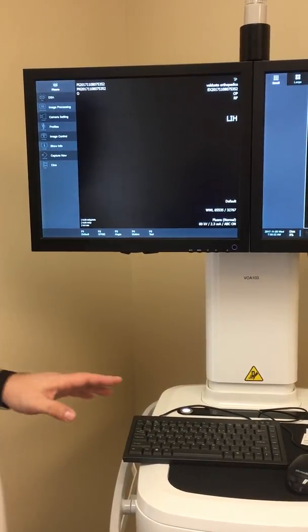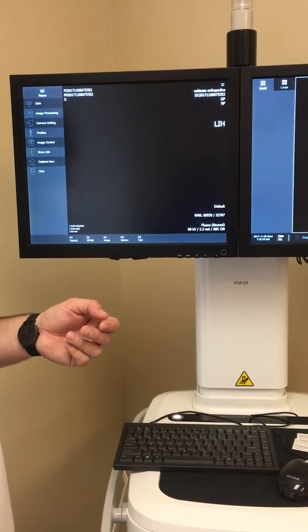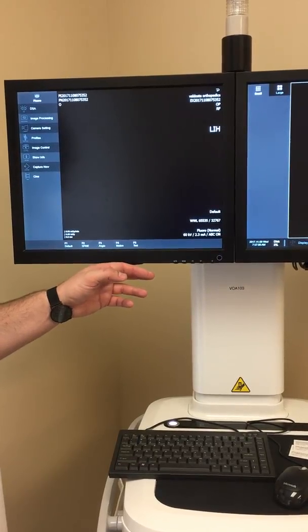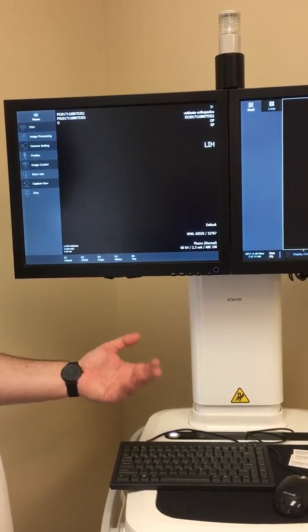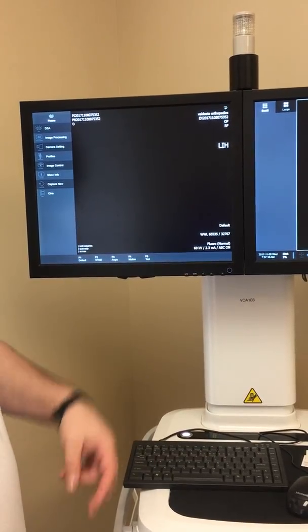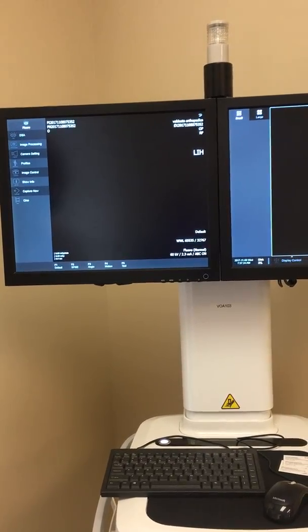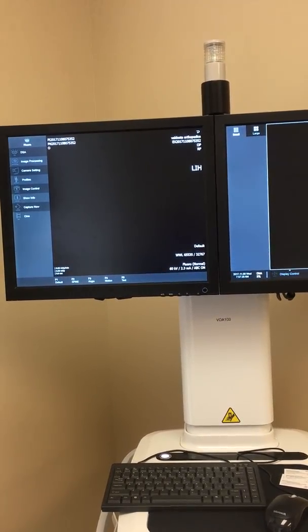But if you do have issues, like when you do a cervical and it's really washed out and we can't get it right, we can make a profile that will change the image quality adjustments so that it brings that brightness down in that specific profile, because you don't want that everywhere, only when you're doing a certain procedure. So we can add a cervical, you push F6, and then it just looks real good, and when you move on to the next procedure, you just go back to default. Even if we don't do that for months from now, I can always remote into the system.